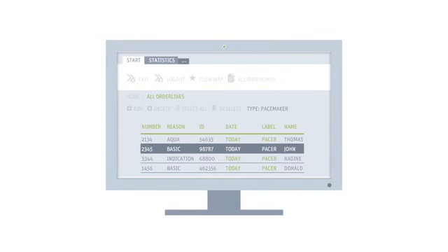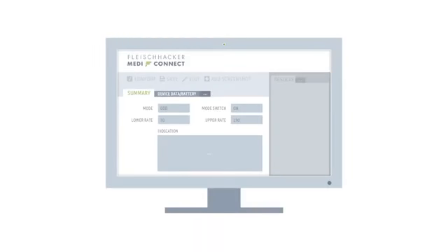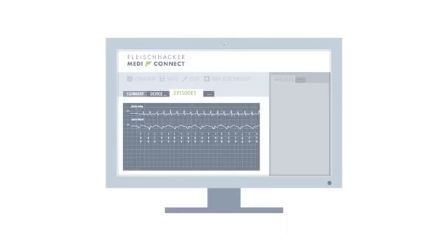This activates the data import process. The data is sent from the USB stick to the PC, and the data from the follow-up can then be reviewed. Once the import is completed, pacemaker and ICD data are displayed in the same structured manner for all devices. Results data is organized into tabs, each representing a different category or a different form of data display. EGMs from Medtronic devices are imported as raw data and can be analyzed and measured in detail.